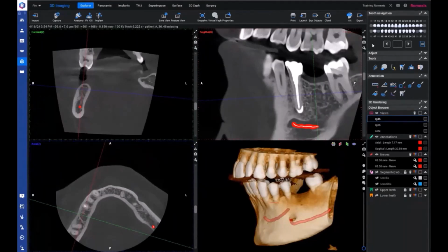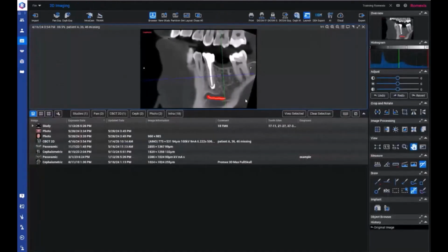So therefore, we also have here this camera icon. It's called Quick Shot. You can find it on each of these categories. So if you click here, for example, I click now there. So you saw the screen flashed, and that meant that specific view was saved now to the 2D module side. So it is saved here.